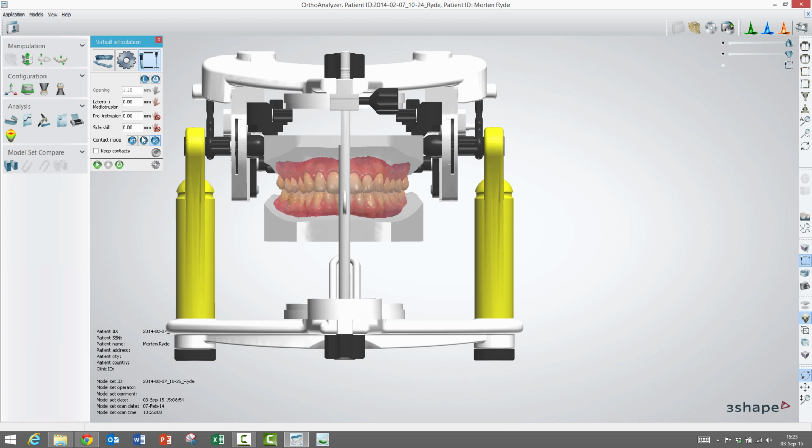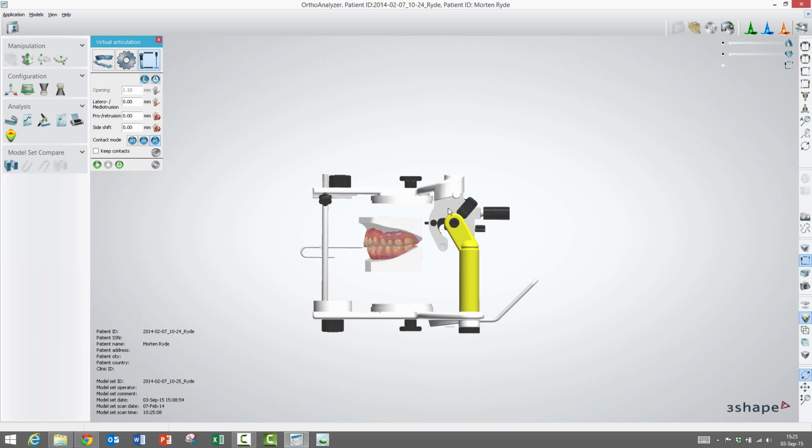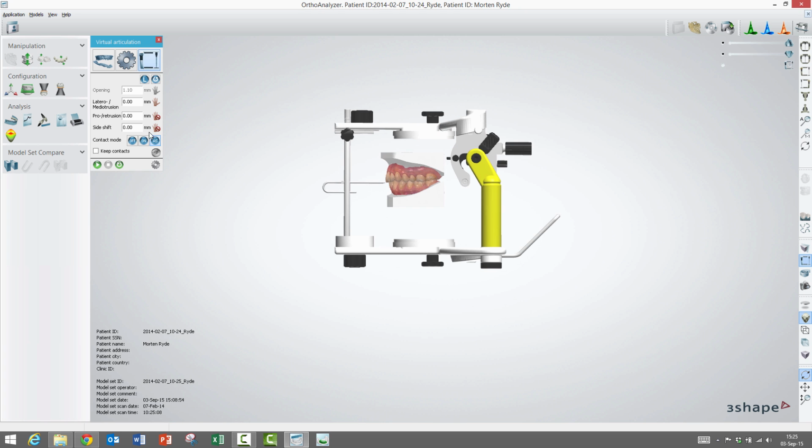In here, first of all, you also have the ability, as we had before in modify the alignment of the jaw, to create an open bite, but this time using the axis. So it will simulate the movement of the jaw. I will have to click in opening here. So first activate on opening.